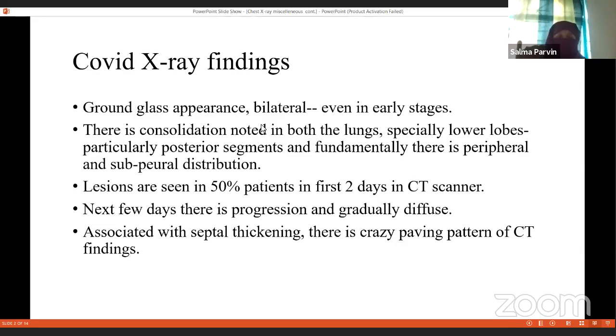Later on, an association of COVID-19 pneumonia and pulmonary thromboembolism was found. And peculiarly, pulmonary thromboembolism has similar radiographic findings to the X-ray of COVID pneumonia. So the association of COVID pneumonia and pulmonary thromboembolism remains a challenge to differentiate.